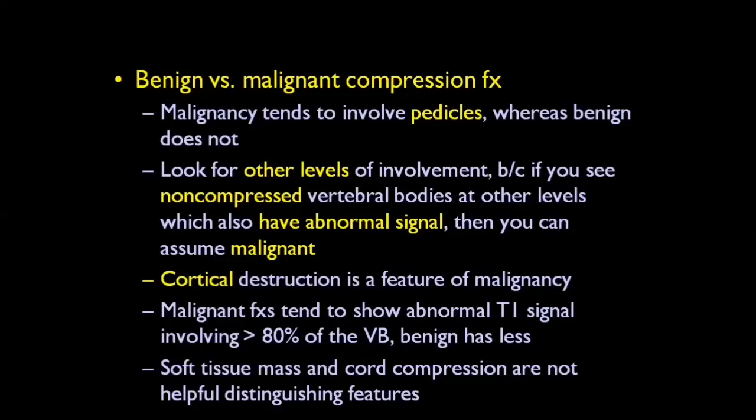Important topics in the exam: how to differentiate between benign and malignant compression fracture. You will see this type of question in every exam, either as an MCQ, a short question, or a long question, and you should know the differences carefully. As you know, malignancy involves the posterior part of the spine, like the pedicles.